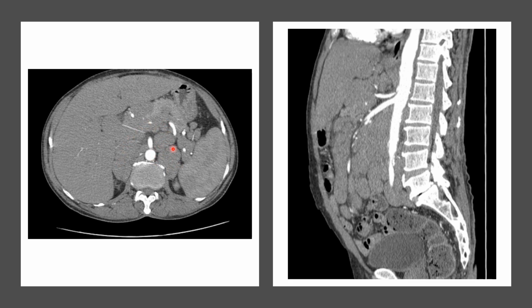seen in the abdomen, in the para-aortic, retroaortic region, and it is encasing the vessels almost, and in the sagittal section we can see that there is upliftment of the superior mesenteric artery, but there is no luminal narrowing seen as such.